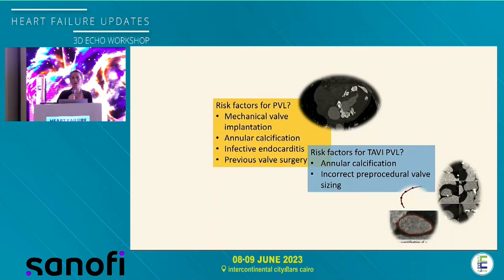And what are the risk factors for a PVL case? Of course, mechanical valve implantation and annular calcification, as you can see here. This is one of the most extreme examples. You can see also myocardial calcifications here.